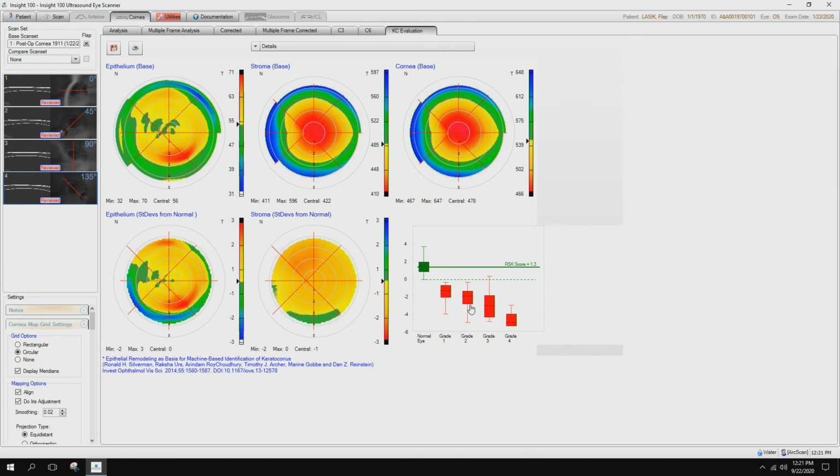These are the 4 gradations of keratoconus patients. If this line were down here in a pre-op, you would make the determination if they're a keratoconus patient. Instead of doing Lasik, you're probably going to do an ICL or maybe even a PRK on that patient.